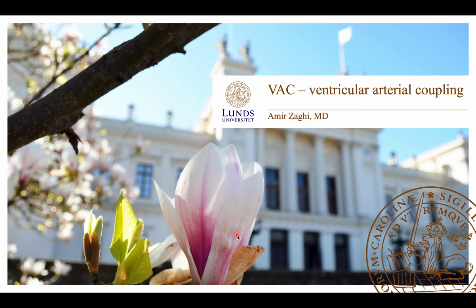Hello everyone. My name is Amir Zaghi, and today I'll walk you through how to measure arterial elastance and end systolic elastance ratio to establish VAC using standard echocardiography and blood pressure data.